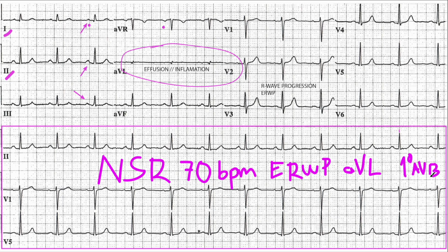Again, we don't know anything about the patient. And now, let's say you don't know the symptoms, you don't know anything, but somebody comes along and says, hey, that ECG was taken after a patient ran up a flight of stairs and got into an argument with their spouse. If you ran up a flight of stairs and your heart rate was at 70 beats per minute, that might be a problem. Either you are really ready for the Olympics, or there's an issue and you're not even ready to step out of the house.